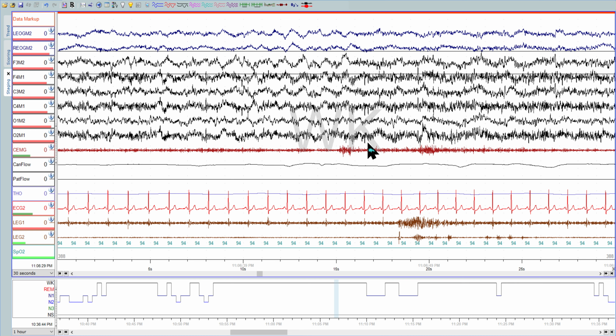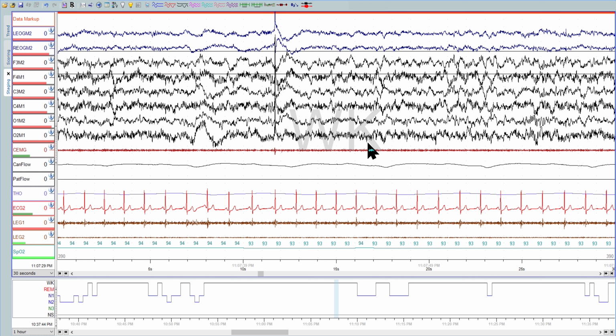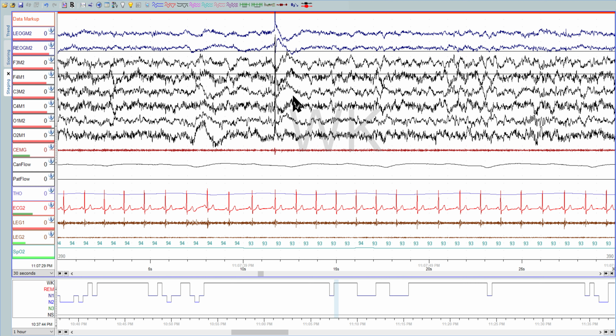Good checking on those wires. It's really good. Diligent. I think this is 1 here. So let's go back. I think it drops off right around here. So this would be stage 1. This would be a stage 1.